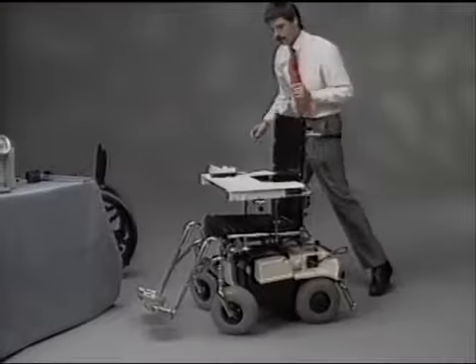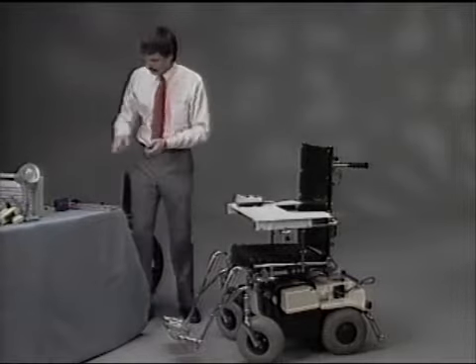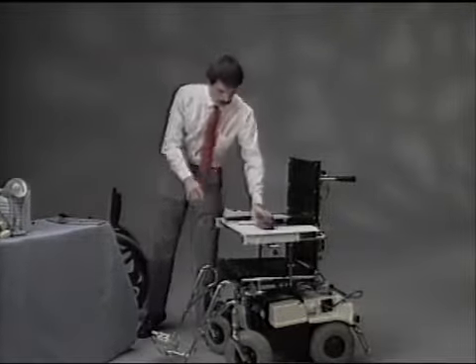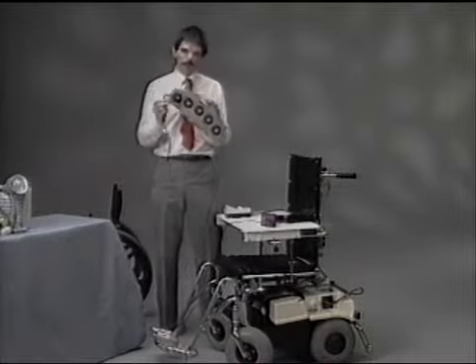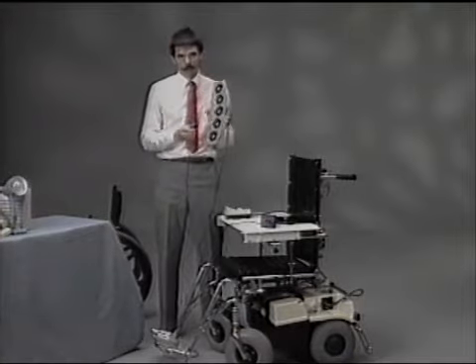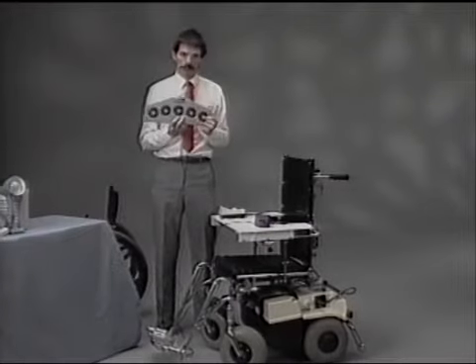Okay. I can change this power wheelchair to operate not only with that proportional joystick, but with a number of others. Now here's a joystick, and you're probably very familiar with this one. Here's another joystick, and here's a joystick. All three of these do the exact same thing. They can be plugged in any Atari or a Commodore computer, and they all work off the same premise, that they have 4 directions and a select or fire button.